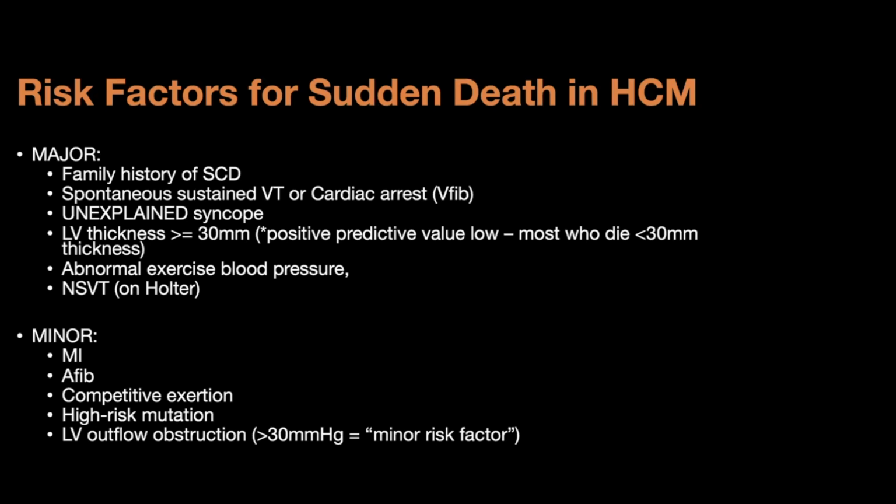It becomes difficult sometimes, so it's really important for our sonographer colleagues to help us show the whole course of the papillary muscle. Having a sweep of the papillary muscle raises an important suspicion of it when we're trying to make the differential diagnosis. So again, we need our sonographer to help us think about what we're looking for. And also echo contrast will be helpful. Typically, we make the diagnosis on the MRI. I follow a bunch of patients with it. The initial description of it was actually from a whole bunch of Korean papers that described this phenomenon.